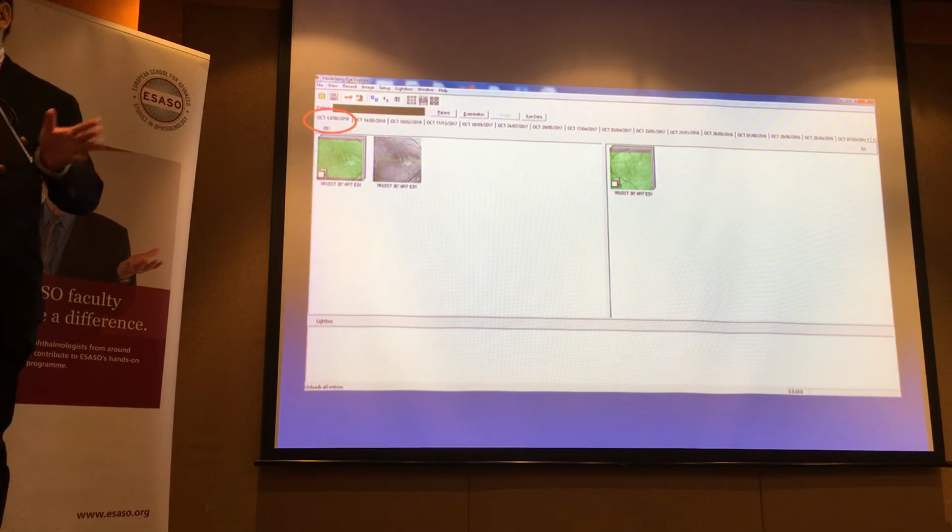Of course, you can say, well, guess what? I can look at this. I see that big red bump there. I look at this thickness band. This whole thing is pink. Yes, you can. I agree. But I would still think that the most important thing is we can view this.